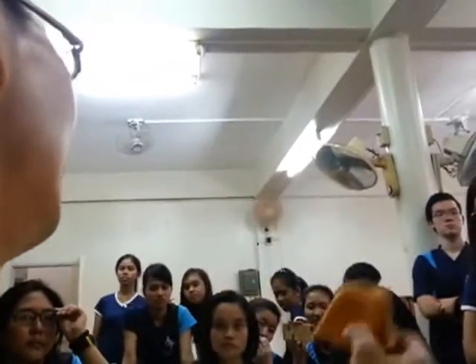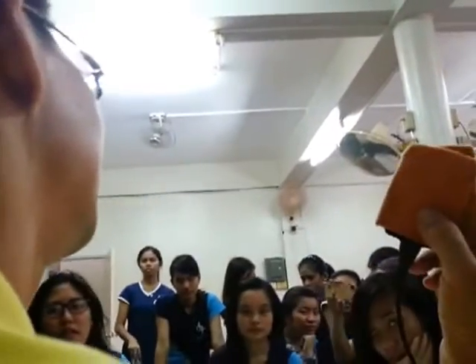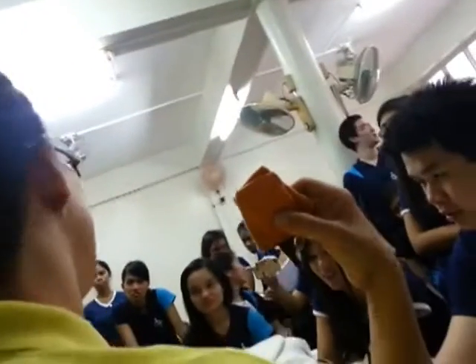So every time, if you're going to stimulate a muscle, you have to again review the location of the different muscles. Look at your case, like you have these wrist flexors. Where are the wrist flexors, for the specific muscle? You have to know the location of these muscles. You have to review again the location of the muscle before you apply it in the practical.